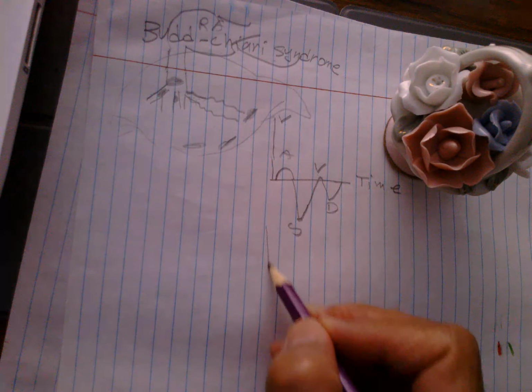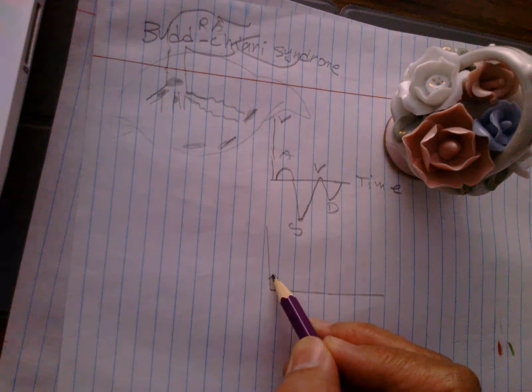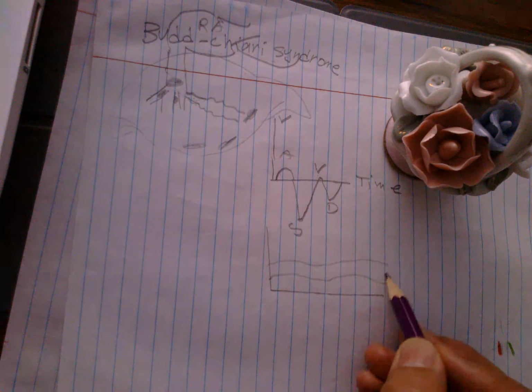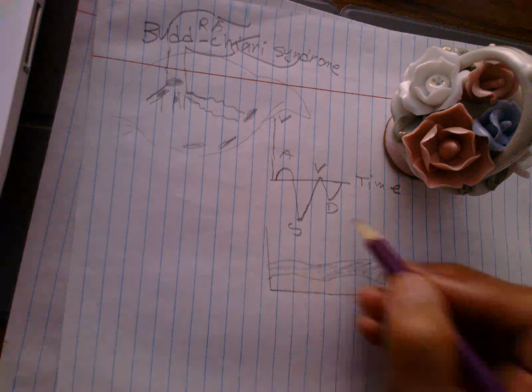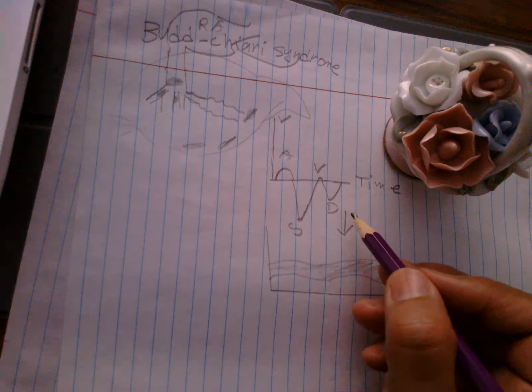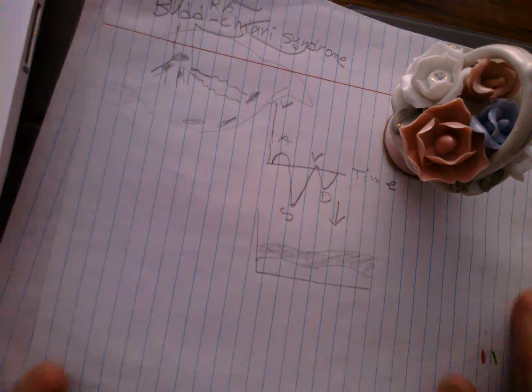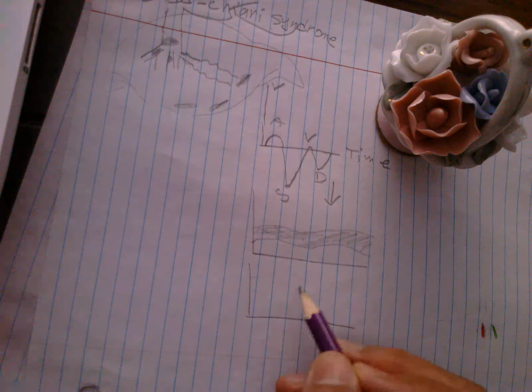But if we have thrombosis, if it is partial thrombosis, we have a continuous phasicity like the normal portal vein, but it is in the wave of the hepatic veins. So it lost the pulsatility to continuous flow in partial obstruction, then complete absence of any wave.